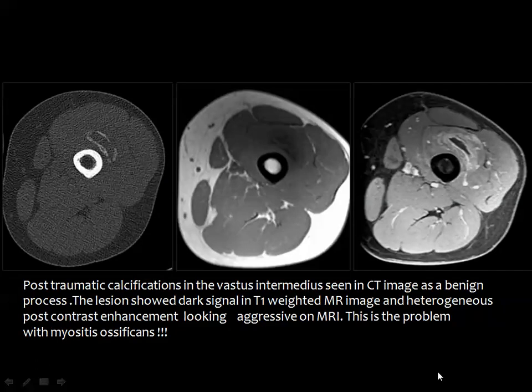It is usually stated in the literature: you see a bony mass in the plain films and on CT images, but on MRI T2 weighted images they show bright signal, and they also show enhancement on T1 weighted image. This is the T1, you see this lesion ill-defined within the anterior thigh muscles, and this is the T1 post contrast with fat suppression, you see enhancement of the lesion.